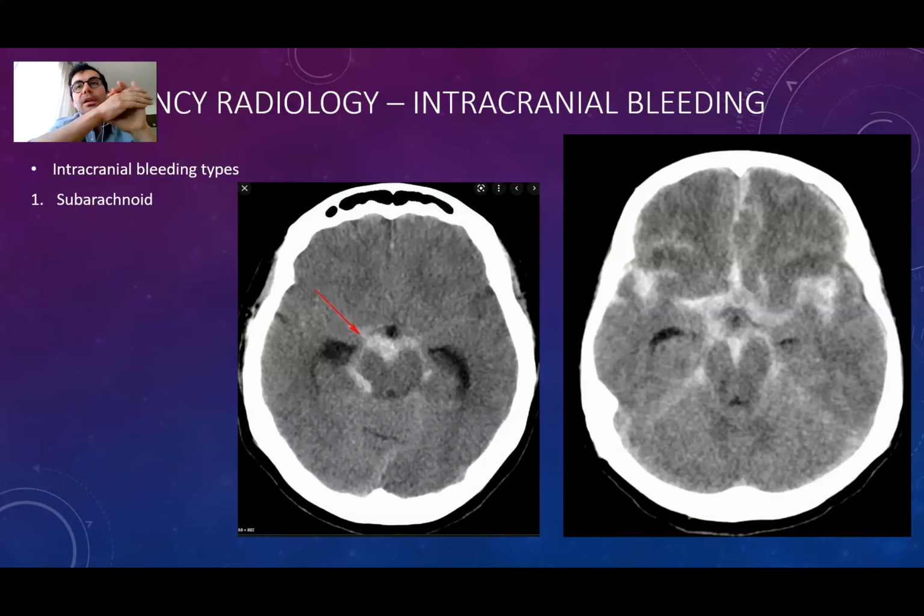I've got a question. When you see something like the patient on the right here, let's speak about why this patient is at very big risk, and what is your pre-diagnosis? Can you think of something in a case of extensive subarachnoid hemorrhage?